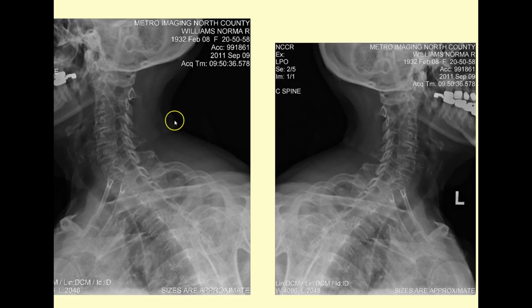Here we are looking at the same patient, and we're looking at oblique views. Again, we're intended to be able to look at one set of posterior elements at a time. You get one body, one facet complex, and a look at the spinous process. And again, going up to the very top, this is the only really good intervertebral foramen, or IVF, they have presented. It looks good on both sides. Just one level down, you can see facet hypertrophy has intruded into the posterior part of the intervertebral foramen, as it did one level lower.